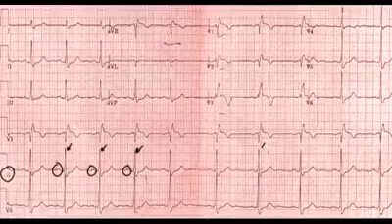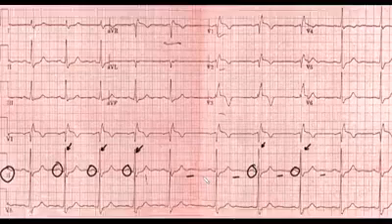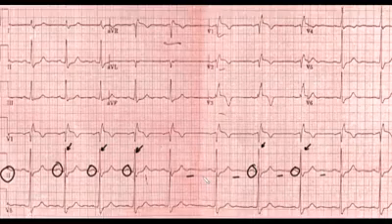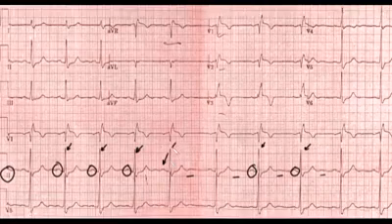Here's another QRS complex, here's the P wave. QRS, P wave. We don't see extra P waves, although there is this little extra beat here, and you probably can figure out what that is. That's probably a U wave, sometimes associated with low potassium. But clearly we see there are P waves before each QRS complex, and so we're going to call this sinus rhythm.